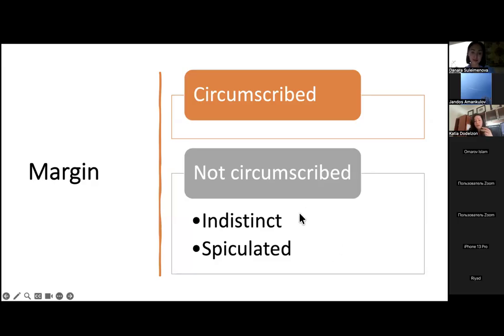Under not circumscribed, there's 2 other descriptors, but at the end of the day, the only thing that matters is is it circumscribed or not. If it's circumscribed, more likely to be benign, although certainly, especially triple negative cancers and BRCA1 patients tend to be circumscribed in oval masses. But in general, circumscribed is more reassuring, not circumscribed is more concerning. And then under not circumscribed, if you want to get very fancy, you have 2 options. Either the margins are indistinct or spiculated.